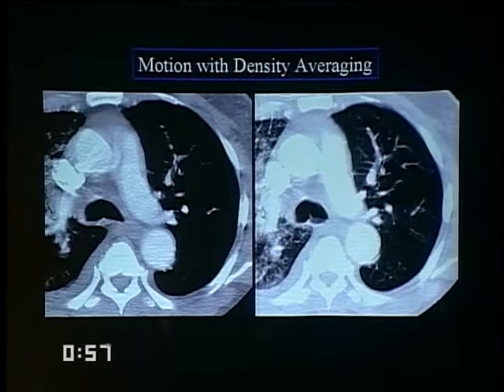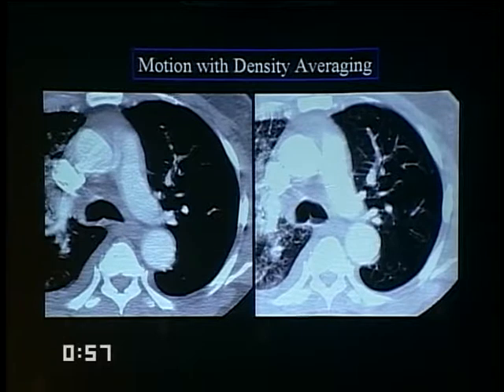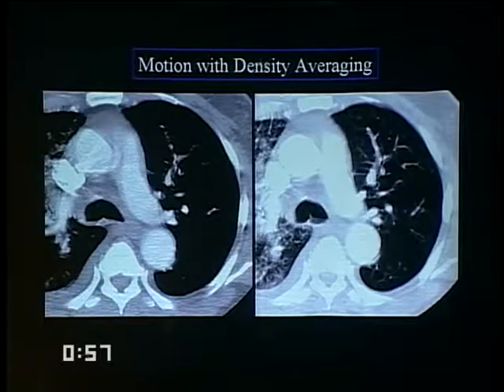One of the best solutions is to view the lung windows. Anytime you have a problem, look at the lung window for the same level. Very apparent that we have a bronchus overlapping and being averaged into this vessel in the z-axis. As the patient breathes, the lung moves up and down. We average the structures above and below into those vessels.